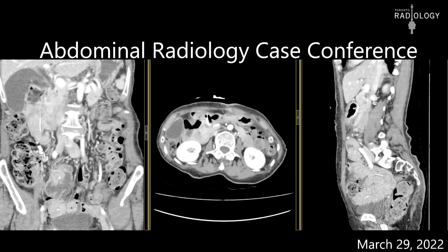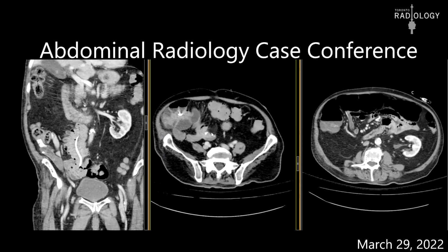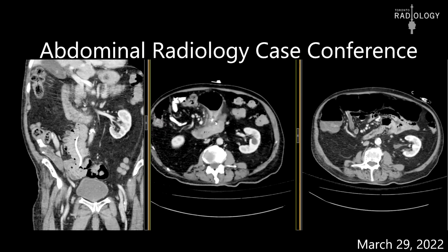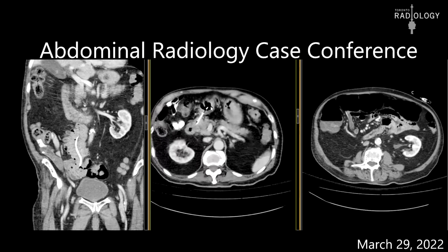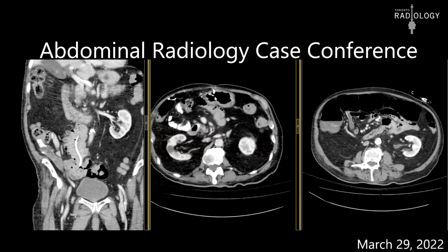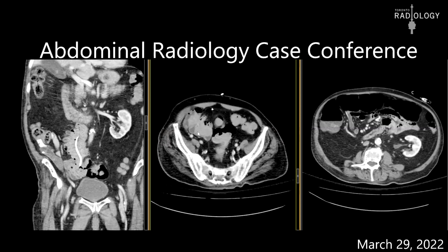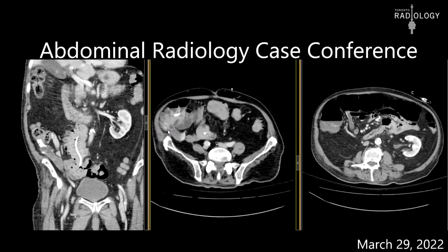Later, I obviously had to see if similar cases were described elsewhere. And one week ago, there was an exact similar case, which I'm going to show you here, with the exact similar presentation. Once again, we have a tube here, and it enters here. The bumper has moved a little bit, but not too much. But then once again, we see that the tube is going on and on, and it just kind of stops here.